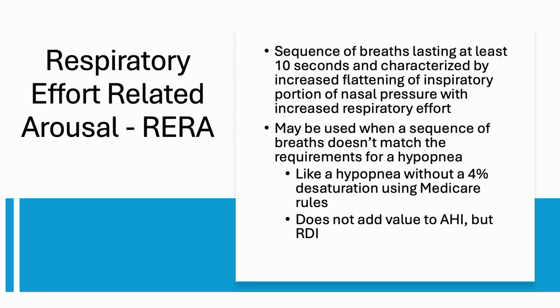We do expect to see some sort of flattening or signal loss in the nasal pressure, but there is no specific requirement. Again, these events do not contribute to the AHI, the apnea-hypopnea index, but they do contribute to the RDI, the respiratory disturbance index. Some insurances don't consider the RDI as serious as the AHI and don't consider it a qualifying value for therapy. Nothing gets in the way of trying to help patients more than insurance.